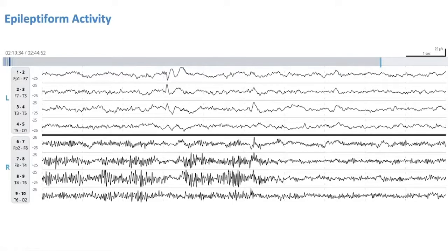And I think what might probably be catching your eye first is the very fast activity, the jagged activity across the right in the first half or so of the recording. You can faintly see dotted lines that are vertical through the entire page. These are indicators of 1 second. And so you get a sense that these jagged lines are actually high frequency because there are too many for me to count within any 1 second period.